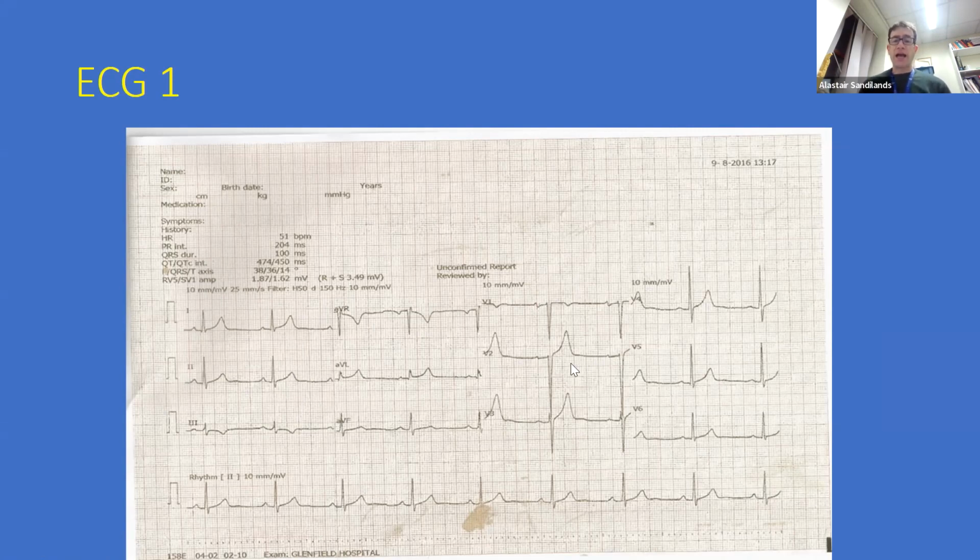So yeah, it's really hard to say, is this hyperacute? I've shown you this ECG before. This is my ECG actually, from 6 years ago. So I'm pretty sure my potassium at the time was okay. I know it's really hard to look at this. And the difficulty when you're a beginner, with all due respect, is you're trying to look at ECGs and look for things. But really, I probably wouldn't say this is hyperacute, in the absence of chest pain. Not quite. I think it's normal.